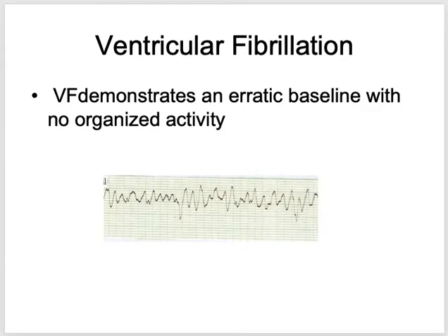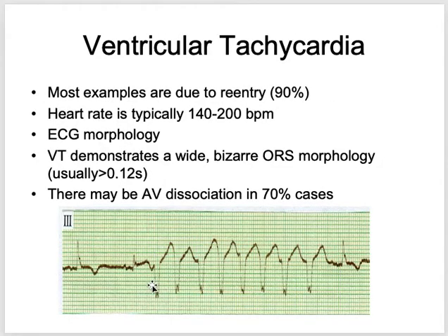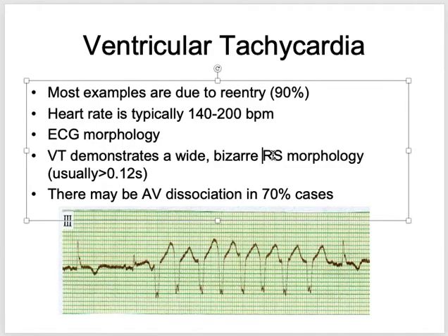And the other shockable rhythm which I showed you is ventricular tachycardia. Now you can see over here, as I was telling you yesterday in the previous lecture, one thing is about the QRS complex, whether it is wide or not. Whenever the QRS complexes are wide, meaning wider than three small boxes, it means that the rhythm is originating from the ventricles.